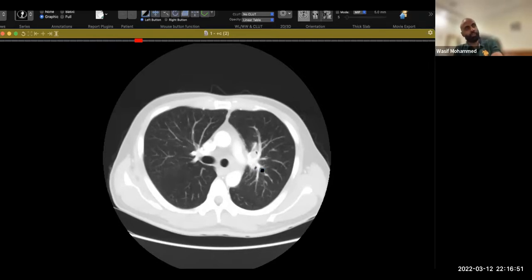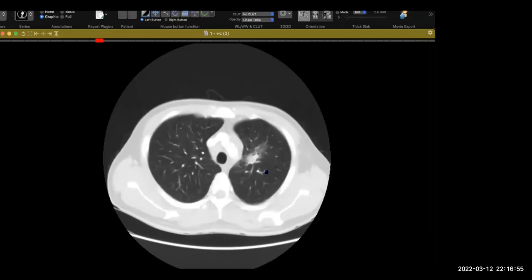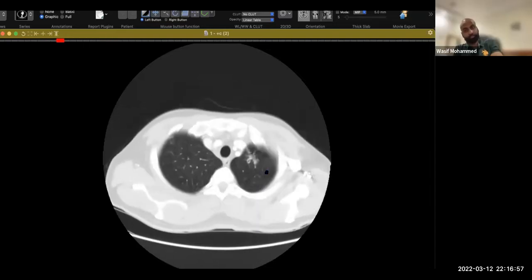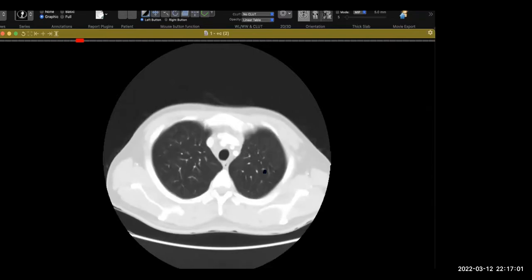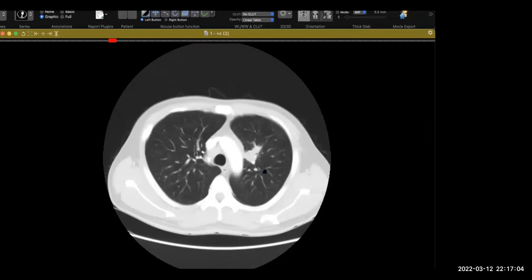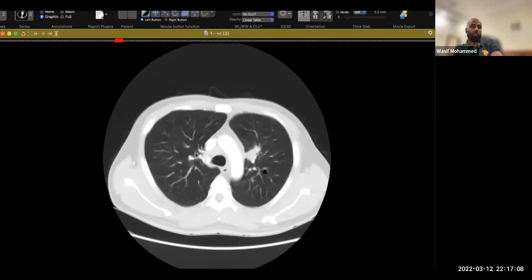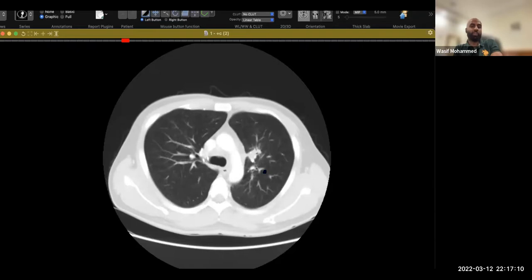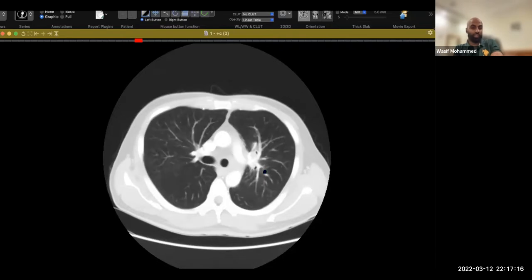I need two more things from you. Okay. I need some negatives. I should check the bones to look for any of these. Very simple. There are no other lung lesions. There's no pneumothorax. There's no pleural effusion. Okay. So in summary, what are the two main findings that you're seeing here?